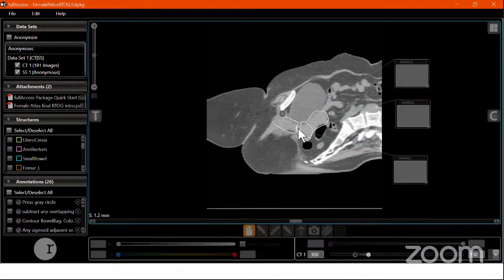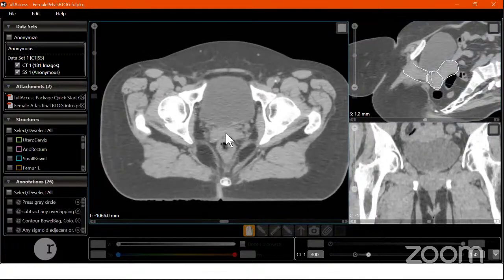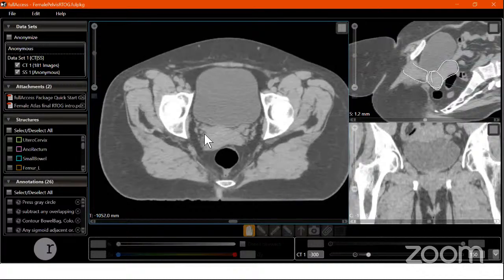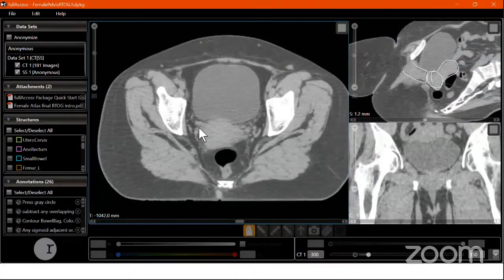So when we talk about parametrium, all those tissues that are lateral to this region become parametrium. All those tissues that are lateral to the vagina, right up to the extent of the levator ani. Lateral doesn't mean going laterally right up to the bony pelvic wall. We are talking about lateral right up to the levator ani muscle. At the lower part, getting the levator ani is easy, but at the parametrial region, let us see what the lateral part constitutes. This is the paravaginal region. The lateral part can go up to the levator ani, and the lateralmost boundary is the obturator internus muscle. For the parametrium also, it's the obturator internus muscle that forms the lateral boundary.